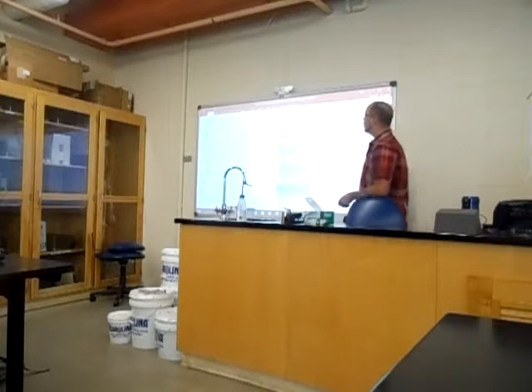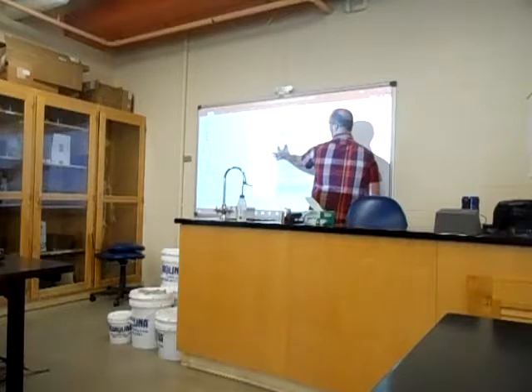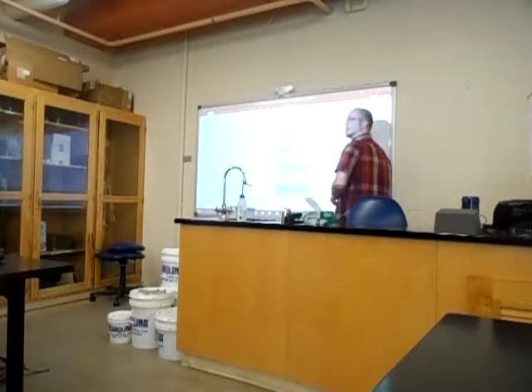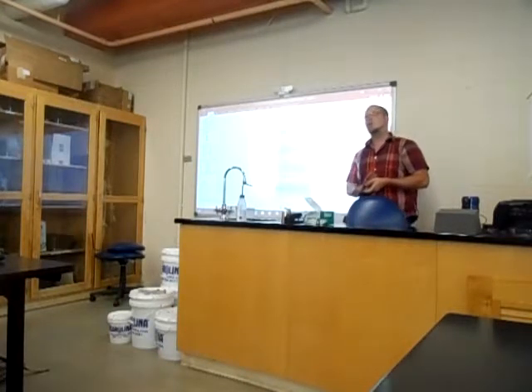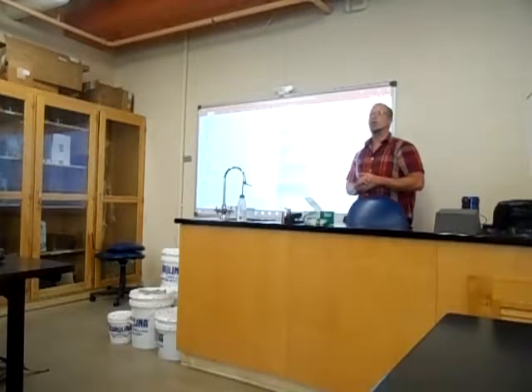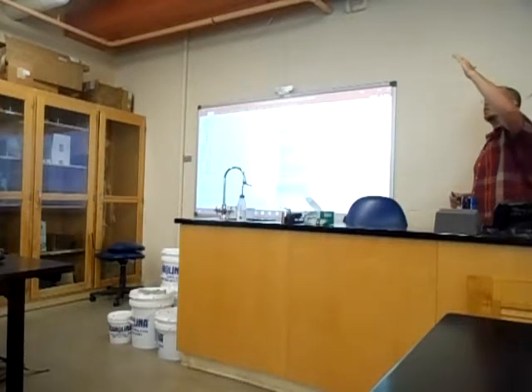Slower heart rate. So remember, this is happening over the course of time. So notice how these are more spread out than these. That indicates that it's happening more slowly, as we would expect. But now that we know a little bit about the electrical activity on the ECG, what else should we notice with no SA node activity? There's no P wave, right? Remember, the P wave started when the SA node generated the signal and then it traveled through the atria. Well, if the SA node's not working, we wouldn't see that.